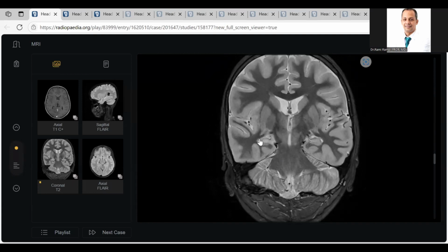Honestly, other signs of mesial temporal sclerosis are not obvious here, like the size here should be less than here, and subsequently the temporal horn should be larger than here. The interdigitation here should be less than here. But frankly speaking, this is a subtle, tricky case. Thank you, doctor, that you picked up the finding well. You did very well. Next candidate.